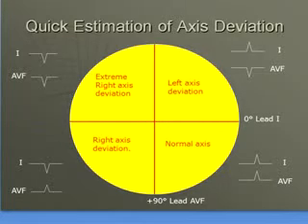That is where the electrical axis will lie. And the extreme right axis, or the northwest axis, will be there when both lead 1 and AVF have negative deflection. In such an ECG, you will find that AVR, instead of being negative, will be showing a predominantly positive deflection.